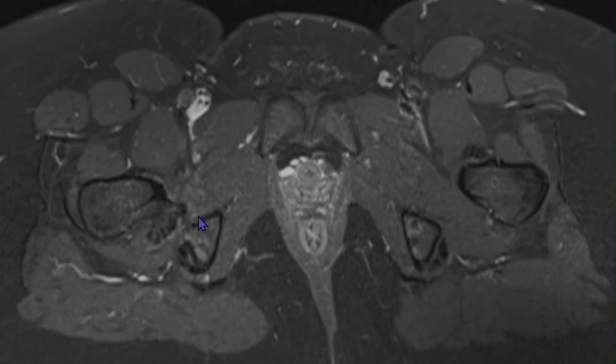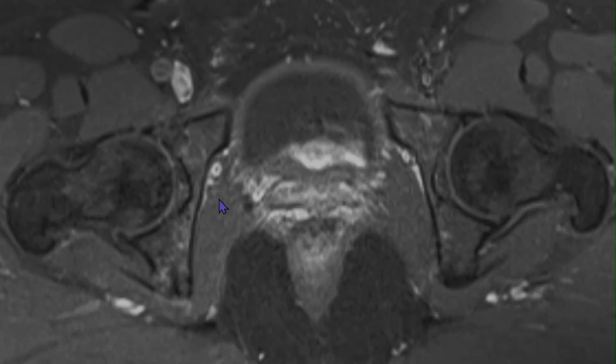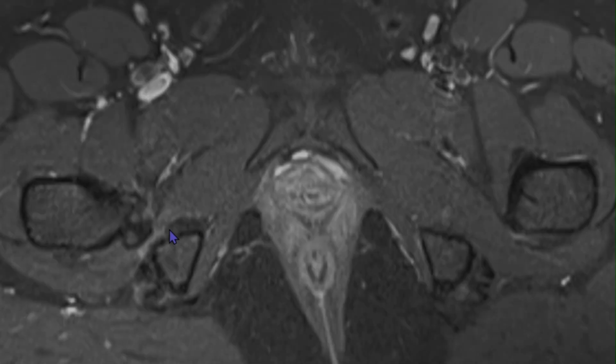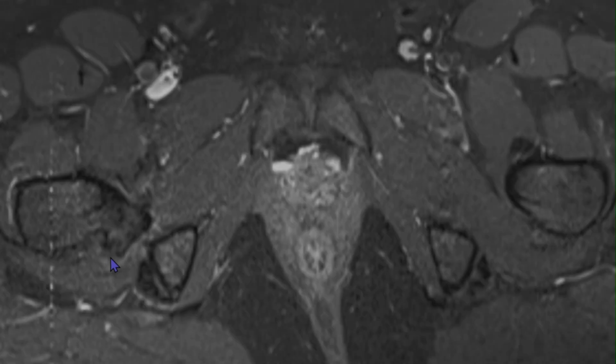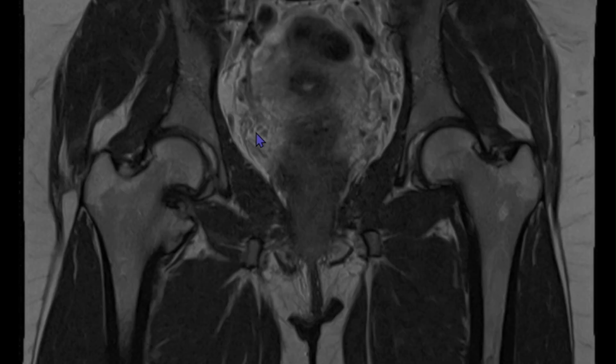For it to be an osteochondroma, it needs a cartilage cap. So this is the cartilage cap of the lesion. In an elderly individual, or where the growth has stopped, usually the cartilage cap is very thin. And in this case as well, we see a very thin sliver of cartilage cap which appears hyperintense. So this is definitely a benign osteochondroma. I'll just show it on the coronal images as well. On the coronal image, we are able to see this better.